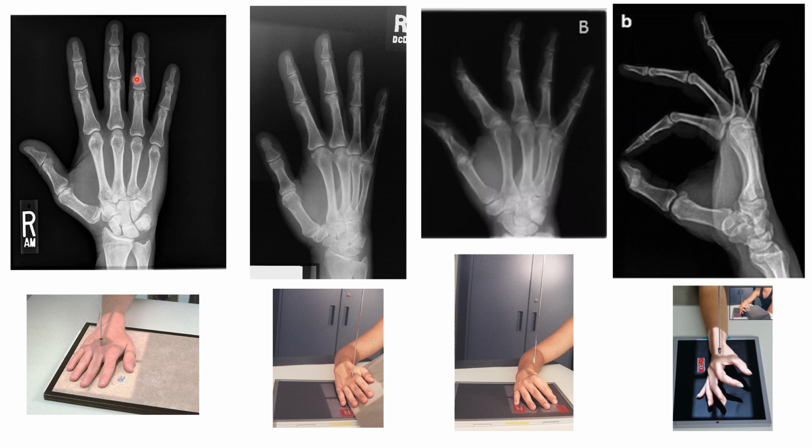We'll be looking to make sure that we've included all the soft tissue of the longest finger superiorly on our image, and then scan the image all the way down to make sure that we've included at least 1 inch of the distal forearm.